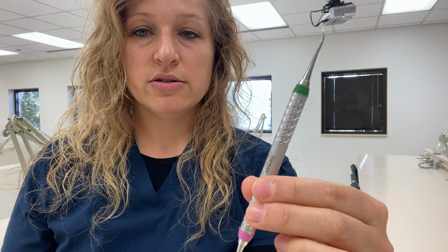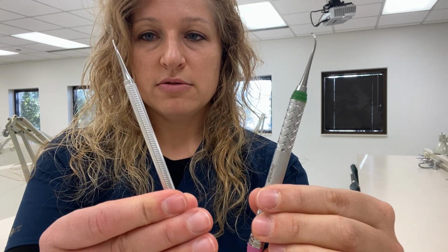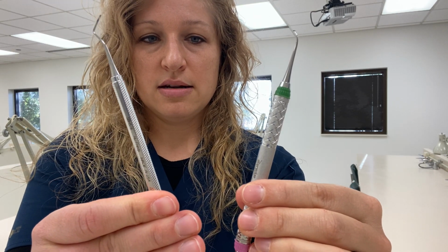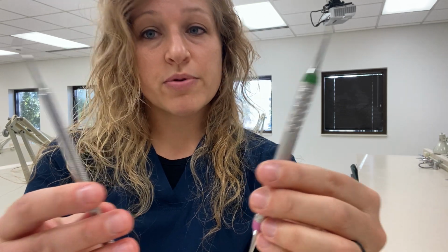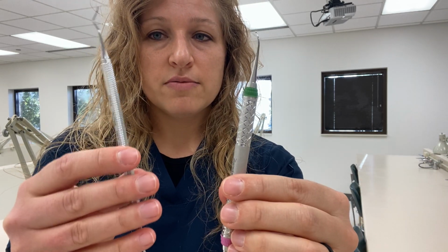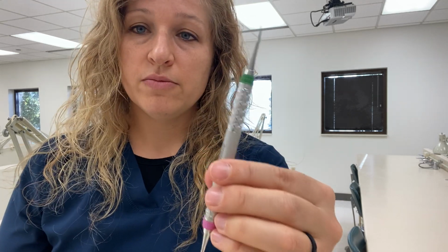Okay, so then for design and classification, there are different things you need to know about the handles. And so what is recommended is a large diameter handle, easier to grasp, as opposed to a thin handle. So this is an ergonomic thing that we've touched on a little bit previously, but this is a thick one, this is a thin one, and recommended would be a large handle.